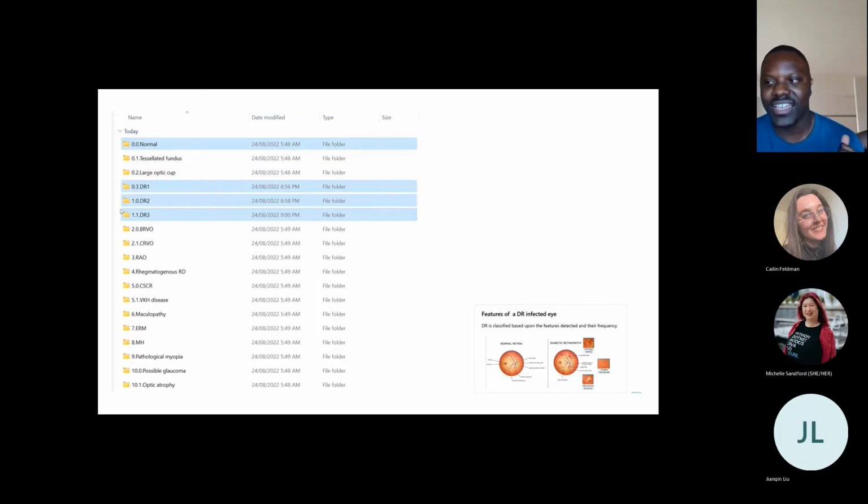Now, I said that we're looking at negative and positive DR. Actually, this is why an image classification model may be useful. This positive is general, but the previous person who did this just classified between negative and positive, but I felt looking at the data set, we can actually go a bit deeper because positive falls under DR1, DR2, and DR3. DR1 is often positive but not serious, in the sense that they call it non-referable. So you don't need a follow-up appointment when you have DR1.